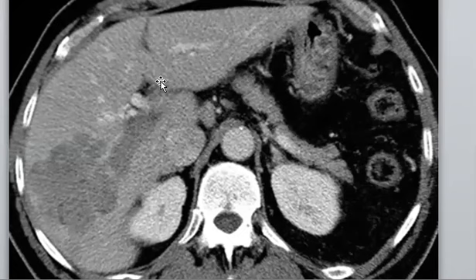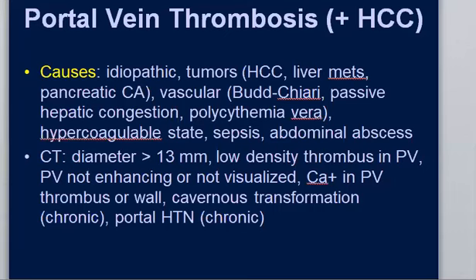That's because it's just one image, but the nodularity, sure, is not very smooth in this case. So sure, it has cirrhosis, and also the focal lesion and the encasement of the portal vein. The hypertrophy of the caudate lobe and the left lobe is not very evident, I agree with you, but to be honest, there is some cirrhosis in this case, at least for this image that we have. Okay, but not very advanced cirrhosis here.